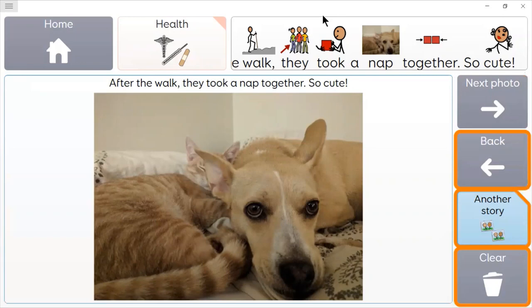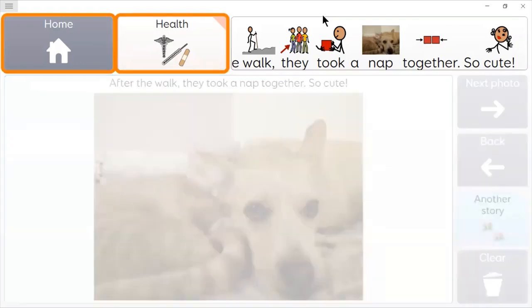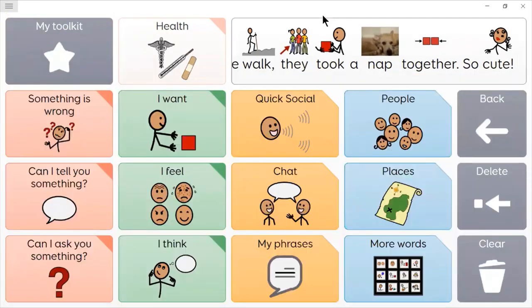Back. Another story. Clear. Home. Health. Okay. Health. Home. Speak message. Oops, I missed it. Home. There you go. All right. So now we're back home.